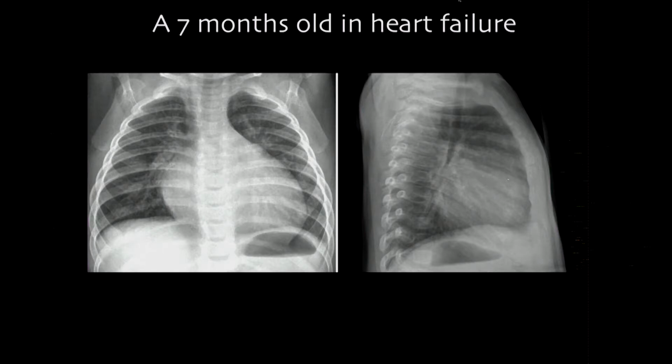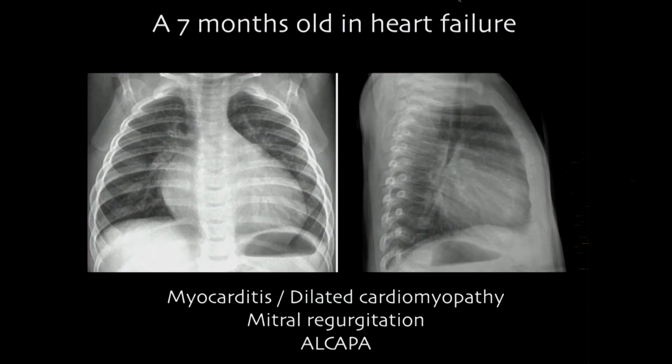So actually the clinical information was dilated cardiomyopathy. Would you be happy with that diagnosis? Could be. Yeah. So these are the differential diagnoses. You have your left side chamber enlargement, pulmonary venous hypertension. It could be myocarditis. It could be dilated cardiomyopathy, failing hypertrophic cardiomyopathy, mitral regurgitation.